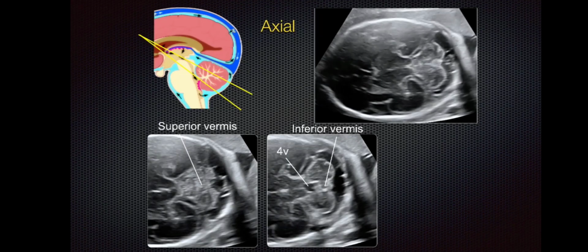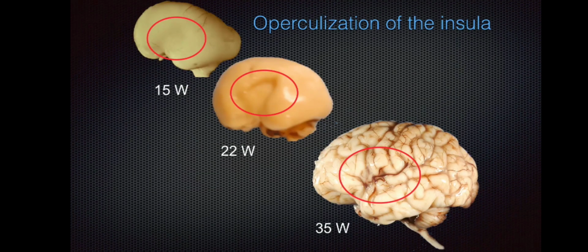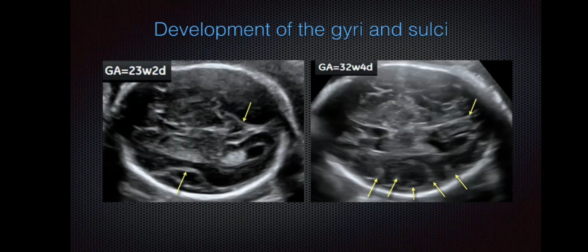The morning is difficult to speak long. We know in the meantime that we should focus more and more on the cortex, and as you see here, starting at 20 weeks, half of the gestation, there is the development of the insula as a landmark for gyration. We knew for years that there are differences between the early and the late brain with different gyrations, but we needed some landmarks and some good studies to highlight this.